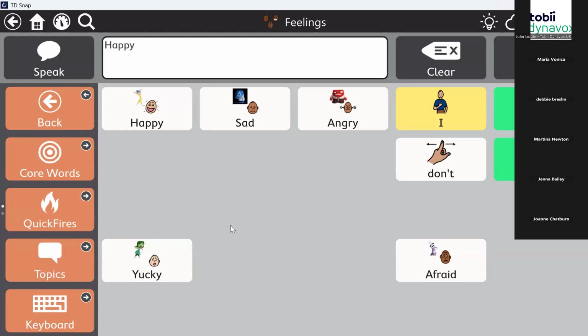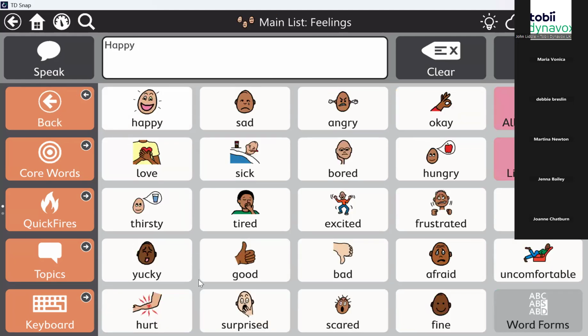But basically, it's just like a little clip from there that they can share. I feel happy from the movie. Again, there are some great Charlie Brown emotions videos. Maybe you can add in those as well. And what I've done is, once I go to that page, if I hit back, I am back at the emotions and the feelings page.